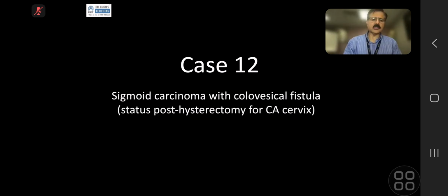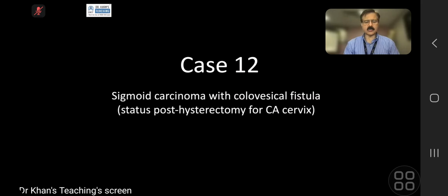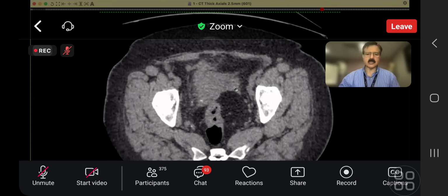So your differential was fine. And I'll just go through the fine touch, but I will accept whatever you told me. It is fine. Actually, it proved to be a sigmoid carcinoma, and it was not a recurrent, but the way you tackled it was absolutely fine. Both possibilities can be there. Let me show you a few fine touch points there.